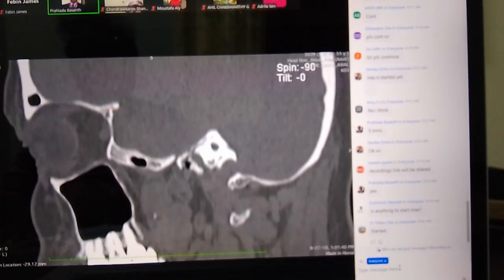It is nothing but the orbital plate of the frontal bone, and this is the greater wing of the sphenoid, and these are small foramina here. See, this is easier here. This is the foramen spinosum. This is the jugular bulb, and this is the ascending portion of the internal carotid artery, which enters here to become the genu of the internal carotid artery. And this is the foramen spinosum and the greater wing of the sphenoid. Pneumatization, pterygomaxillary fissure. Okay, going further.